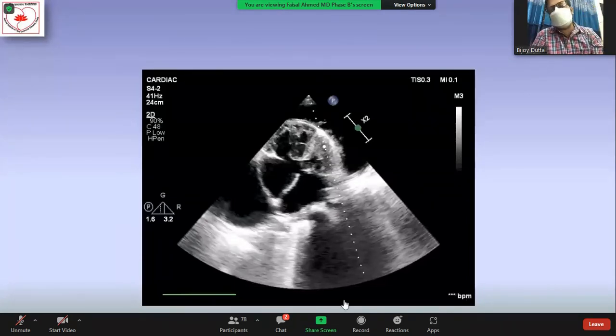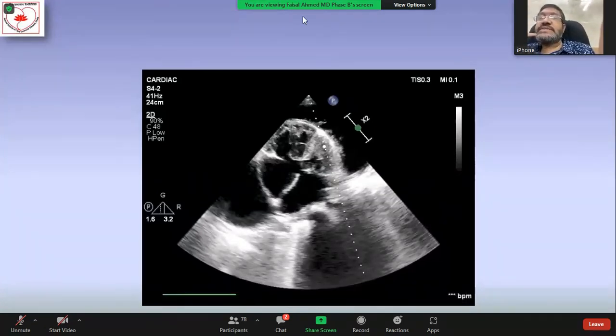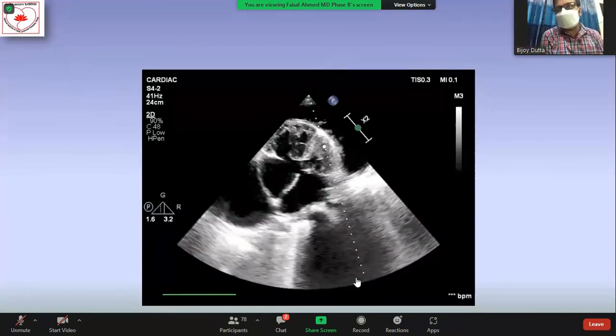If the patient is actually diagnosed with tuberculosis and is getting anti-TB and steroid, the treatment response should be dramatic. But in this patient, you see the pericardial effusion is huge, a massive pericardial effusion. So this diagnosis should be kept in mind also. Of course, as there are fibrin threads, the diagnosis of TB will always come. It's okay, but if there is a long-standing pericardial effusion, there may be a chance of fibrin thread deposition. Yes, it should not be. This is the hallmark of tuberculosis.